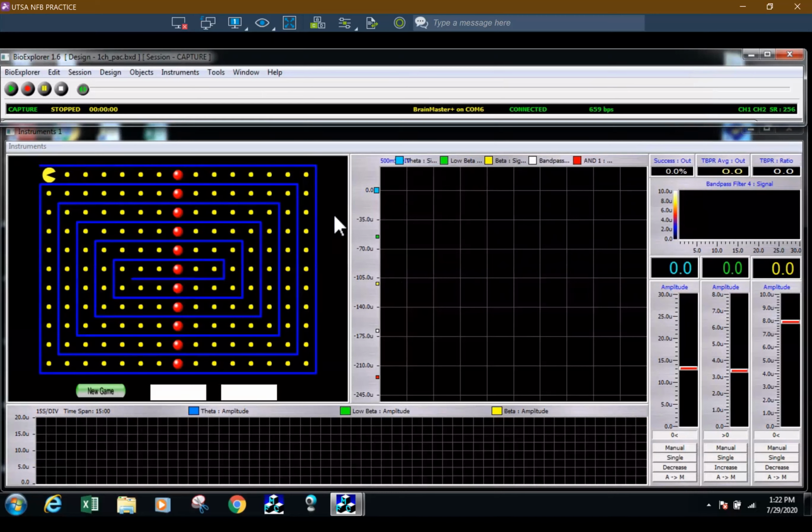And so here is your setup for the telehealth option where you will have everything on one screen. In order to enter in the proper frequency bands for our new client, you're going to want to go down and edit the design.